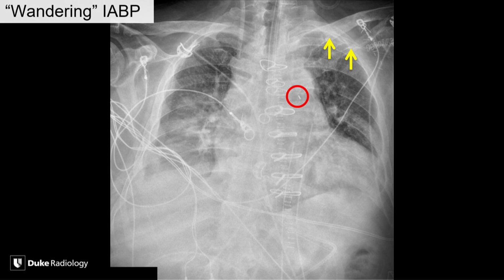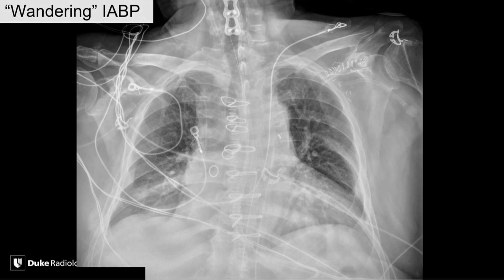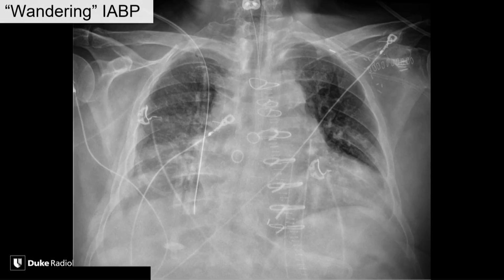There's a marker. I don't see another marker on the film. That's probably the proximal marker. The balloon, the distal marker should be down there. That's day 1. There's day 2. All right, it's beginning to drift, drifting a little bit more here the next day.